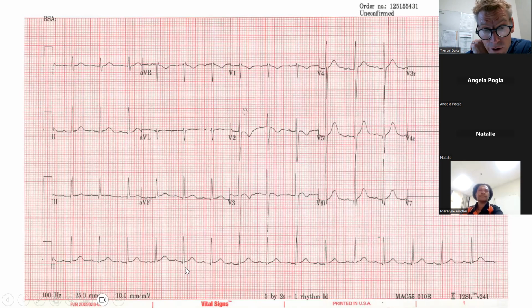Next thing is the QRS duration, and here you've got 2 small squares, right? So probably the QRS duration mostly is normal. It looks a bit prolonged here, doesn't it? So 1, 2, it's probably still 2 small squares in duration. Maybe getting a little bit longer here, right? So you've got a child who's in sinus rhythm with a normal PR interval, no evidence of atrial hypertrophy, who's got a slightly prolonged QRS duration here.